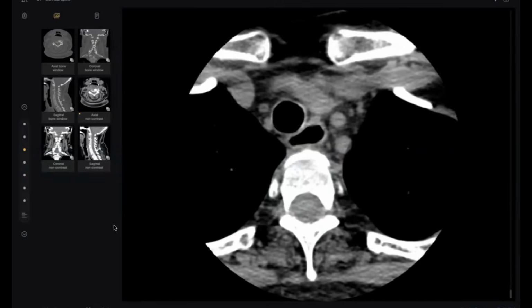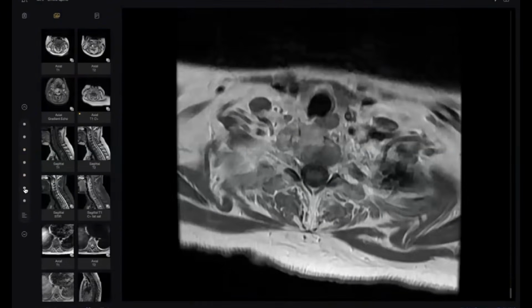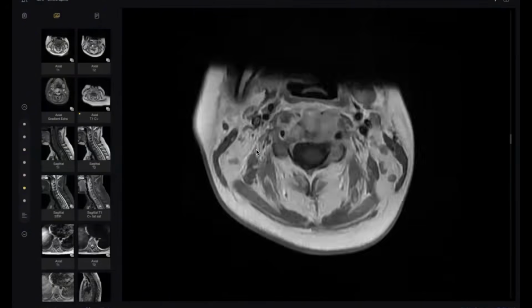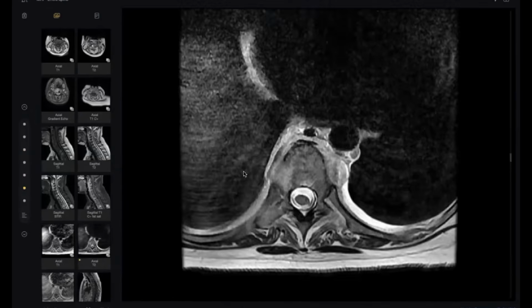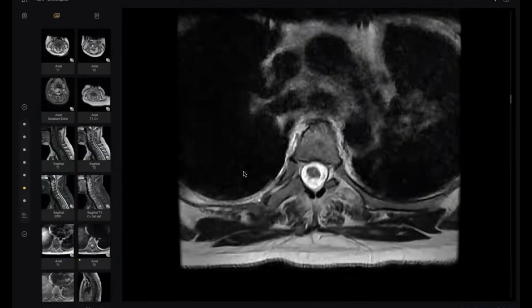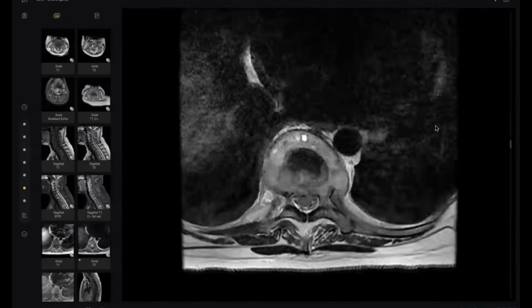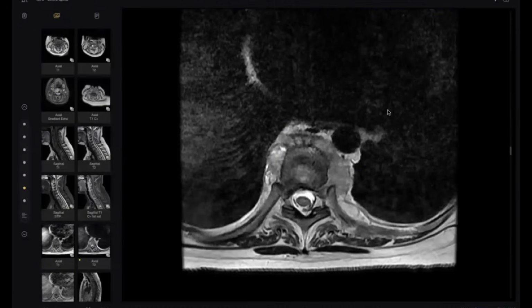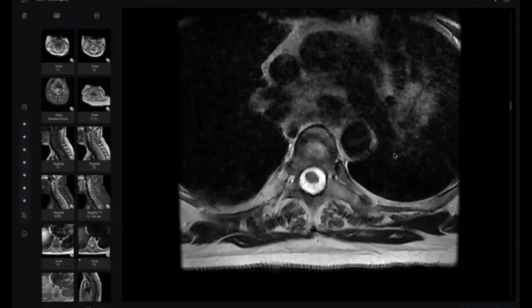Okay. I repeat the question again in the MRI. Do you have any clue? Look at the lung. What happened to the lung? And then I give you this axial. Look at the left lung. What is this? It looks like parenchymal abnormality, I think. See, because this is the heart. By the way, above, there is something here at the hilum, just beside the hilum.